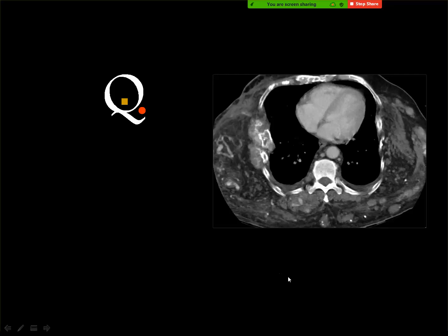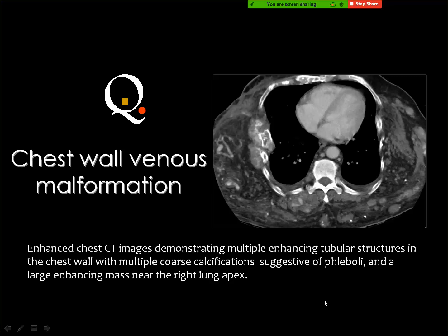Hemangioma? Yes, multiple. And this is a very big venous malformation. The new name of hemangioma is venous malformation, and it is diagnosed by the presence of calcific phleboliths. Whenever a hemangioma is present, you can spot the diagnosis by these minute calcifications.